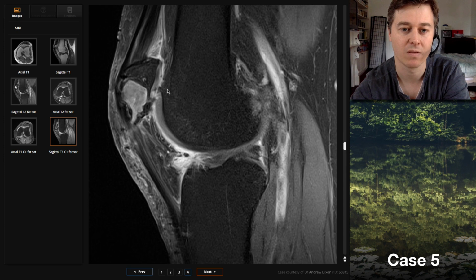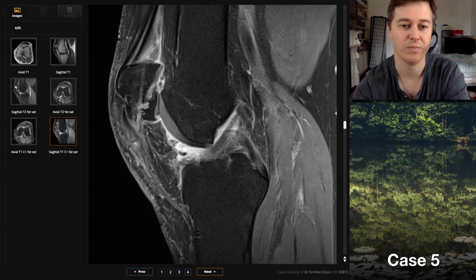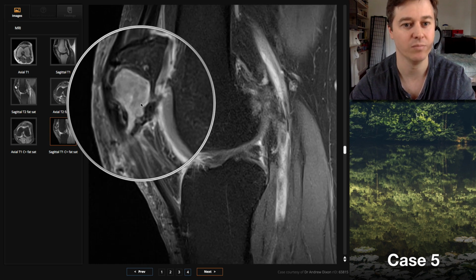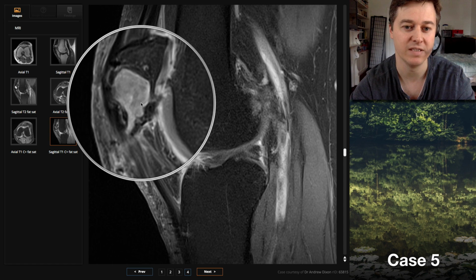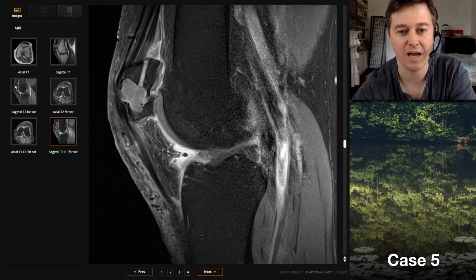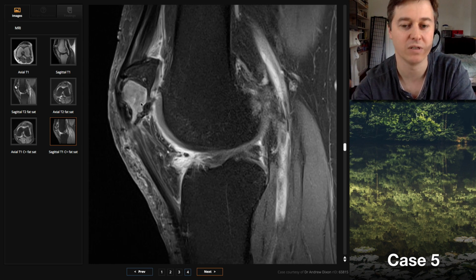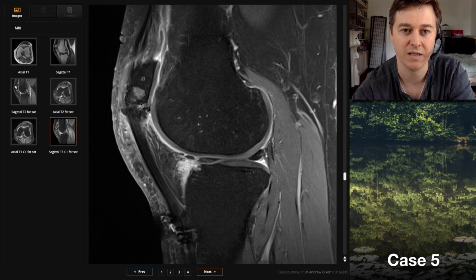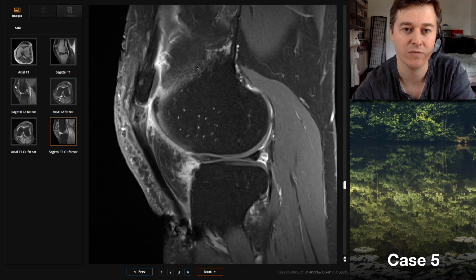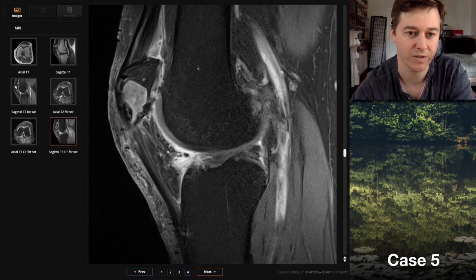But it's possibly enhancing, isn't it? I agree. You'd like to see some pre-contrast T1 fat-sats to know whether this is definitely enhancing or not. And to be honest, even fluid can enhance if it's synovial and it excretes fluid into the joint. You can see that in the knee joint, you've got quite a bit of fluid that's already leaked out into the knee joint fluid, the synovial fluid, just from the lining of the joint.